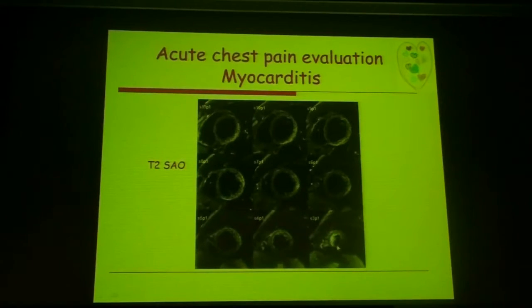And when we're looking very closely, the first thing is to make sure that when we're looking at the apex, we do see the hyperintense subendocardial signal. And again, as mentioned by the previous speaker, this of course is just due to slow flow, so we're ignoring that. However, when we're looking here in the infralateral wall, we do see hyperintense signal in this wall. And if we look very closely, we can see that it spares some of the subendocardium. So hyperintense signal, mainly epicardially.